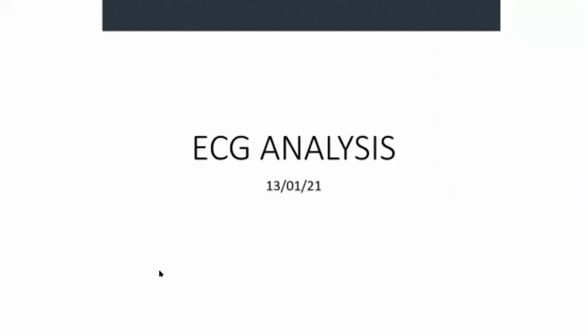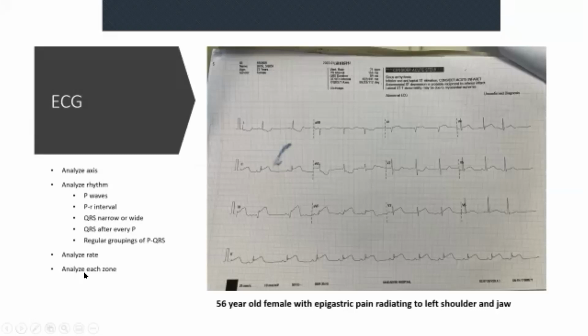So today I'm going to hold your hand a little bit less, in the hope that you'll start figuring out ECGs a little bit, all right? Last week we had a very basic intro, and today we're going to dig a little bit further. So this is the ECG that we are going to be looking at today.